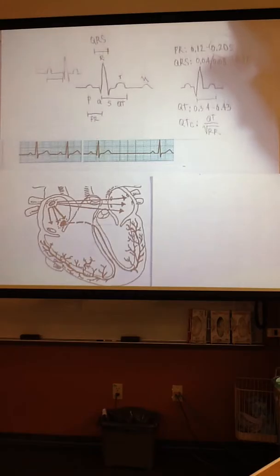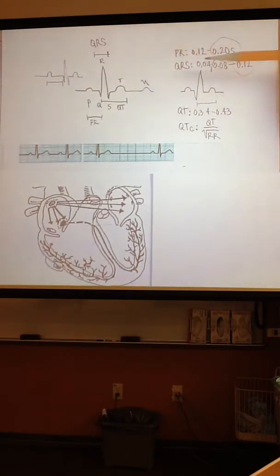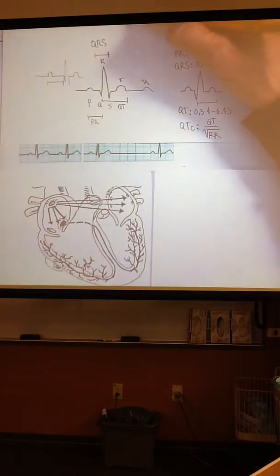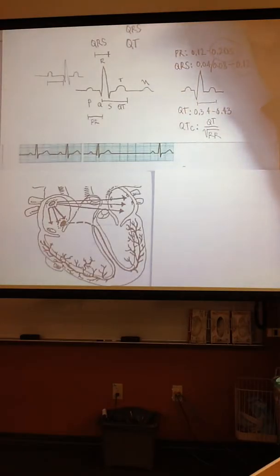So these are all of our EKG waves and intervals. And again, I think knowing the PR interval, QRS complex length, and QT is important.